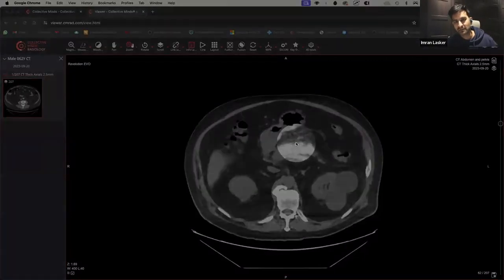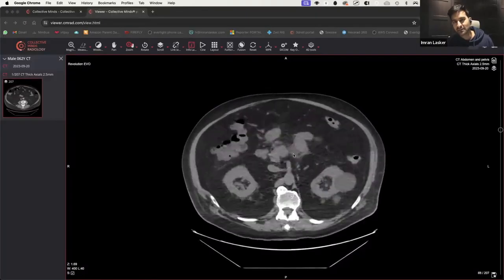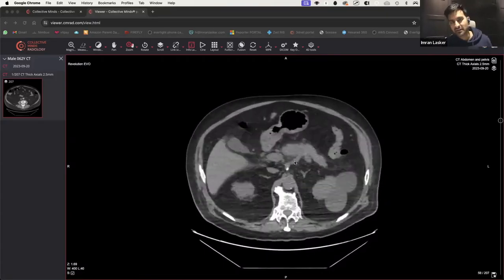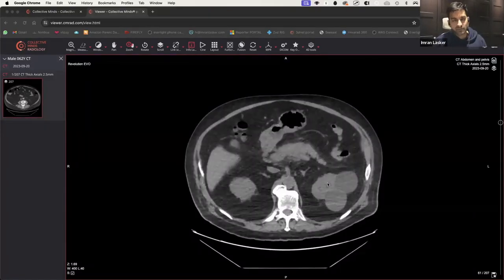Fat over there compared to the fat over there, right? So that fat looks slightly fat stranded. And you come further down, there does look like there's a little bit of fluid emanating from that going downwards. So on balance, when you look at that, you think to yourself, okay, the kidneys look okay. They've got this abdominal pain. They've probably been examined. Someone thought it's right or left-sided.